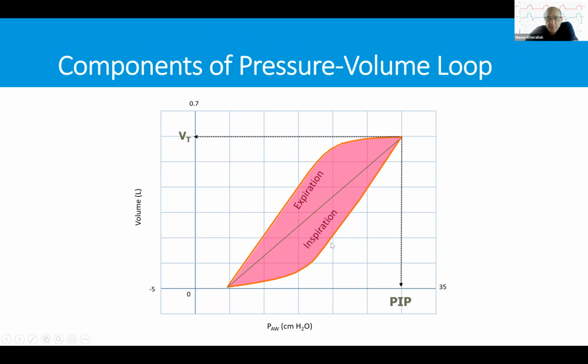And notice that the inspiration is completely different than expiration. Expiration is more passive, and the difference between the pressure in inspiration and expiration is called hysteresis.